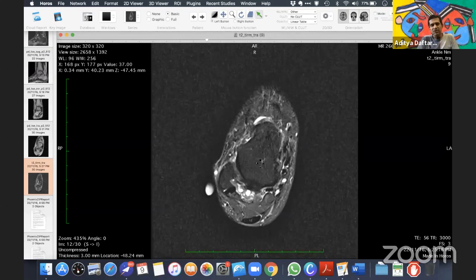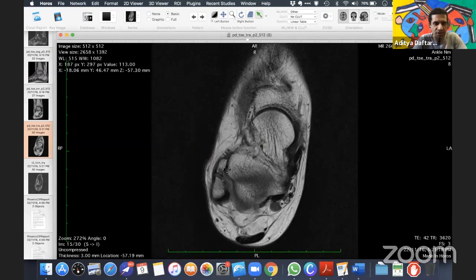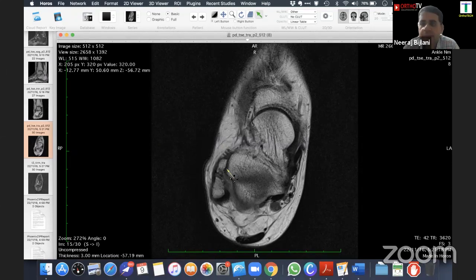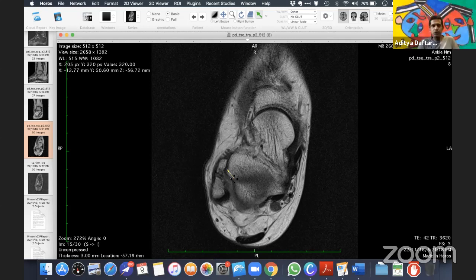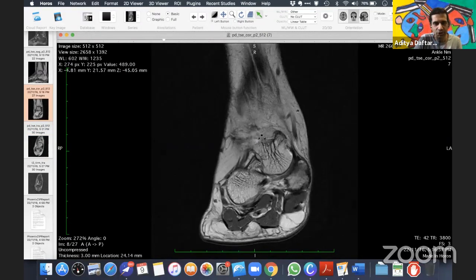So here you've had an osseous avulsion with a very poorly remodeled ligament, because if you look at the ligament here, it's very thin and attenuated, and below here there is bone, this piece of bone here. So this would be a poorly remodeled osseous avulsion of the anterior talofibular ligament from its fibular attachment. Now a foot and ankle surgeon would probably remove that piece of bone. They'd want to look at the X-ray, obviously, to see what was there. And then they would consider reconstructing if this patient has instability. And some of that instability may be masked because of that bone impinging also.